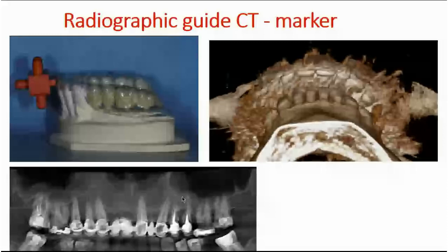the guided element, which will be used to direct implant placement during our operation. In the second situation, we will have a lot of artifacts due to a large number of metallic reconstructions in the mouth, and probably we will not be able in those situations to recognize appropriate anatomical markers, which would perfectly define the matching of the data.